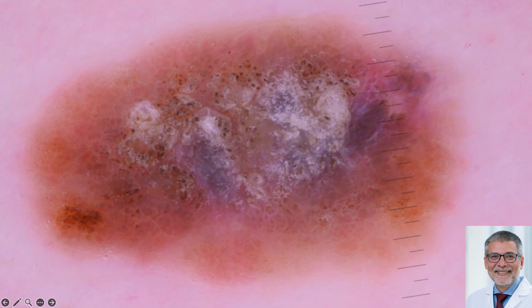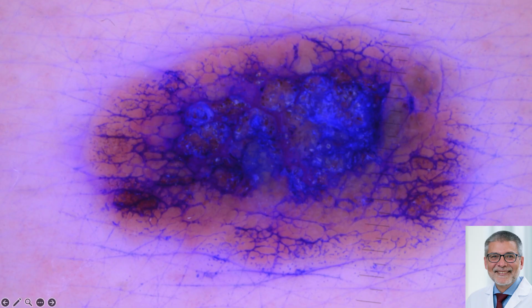So none of the features of a seborrheic keratosis, we do the ink test, and none of the comedo-like openings light up. There are no sulci that light up. This ended up being a 4 millimeter thick verrucous melanoma. It's not a collision tumor between a melanoma and a seborrheic keratosis. It, in fact, is a melanoma, right? So it will help you to find those lesions that are mimicking benign lesions, but obviously it requires you to put your scope on it, okay?